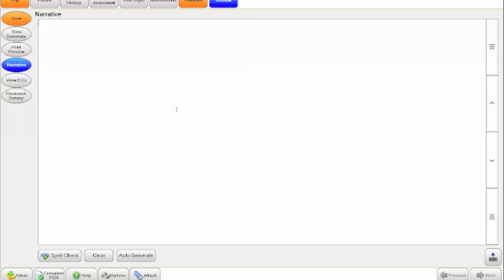So my caution to you is make sure if you decide to use this, you need to augment the report that it's creating to make a full report to truly paint an accurate picture of what occurred on scene. So when I click auto generate, it's going to pull data from the report. Now there is nothing filled out here, but you can see where it says not documented. It'll pull different aspects of the patient, the age, the dispatch complaint, things of that nature.